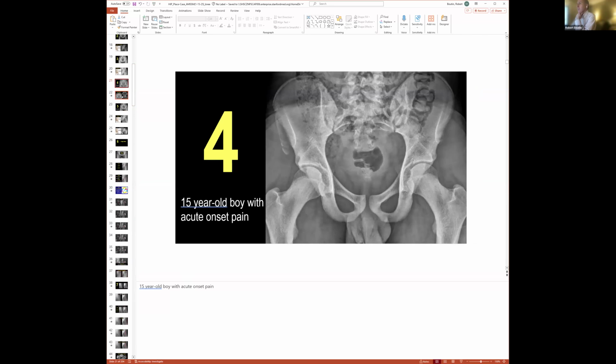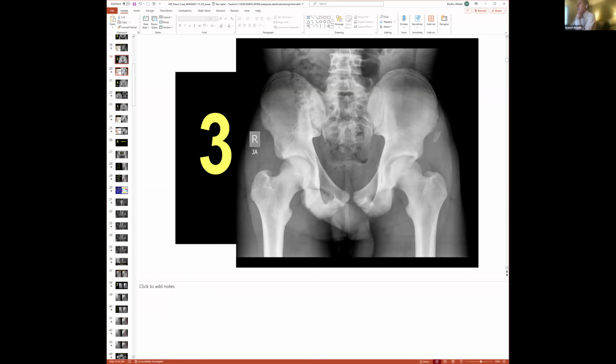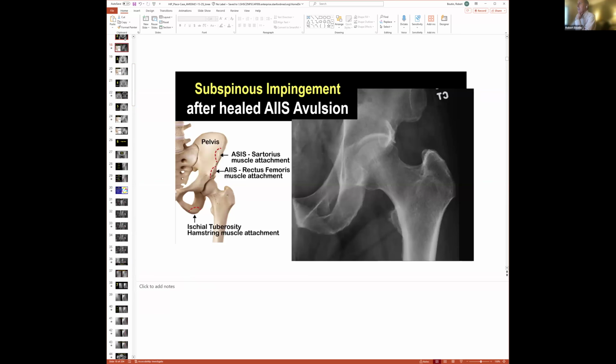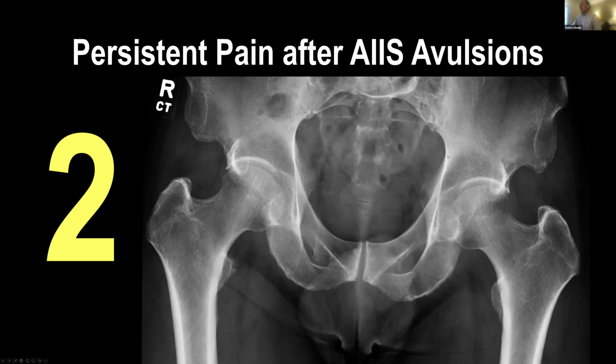The hypertrophic bone is pooching out anteriorly, and so some sort of lateral projection is helpful. So here we go. Since this is draping out anteriorly, some sort of lateral view is helpful.